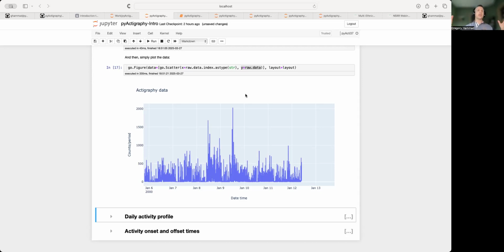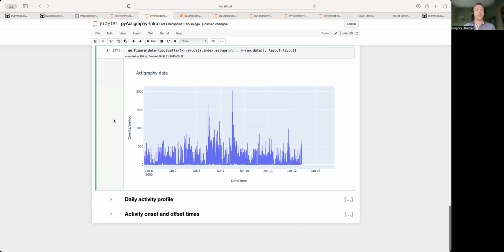It seems silly to visualize the data, but, and that's going to be covered in the next tutorials, the visualization and the cleaning is the most important part. You will see that calculating variables is easy. It's one line of code, but actually it always depends on the quality of your data. So you need to visualize the data to assess the quality, and that will influence your analysis. So basically visualizing and cleaning is a really, really important step. So you should always start with that, and we provide the tool to do this, okay?